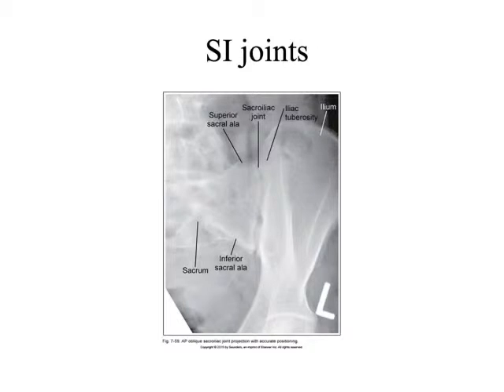Now, they've given us further hints for what we're looking at here, and I'll show you how they did those visual hints. They collimated. And when they collimated, they reduced the width of it, and now they've made the image longer. So what they're telling me when I look at this picture is that what I'm looking at is something that's long. So in addition to saying that the SI joint is centered on this image, how else could I describe what's going on with the SI joint right now?